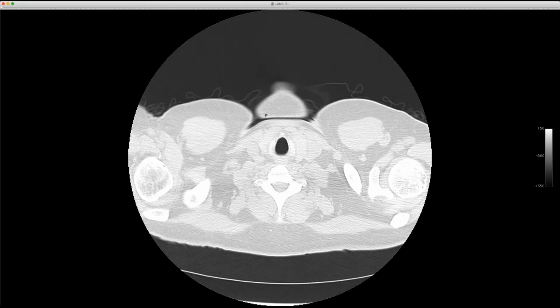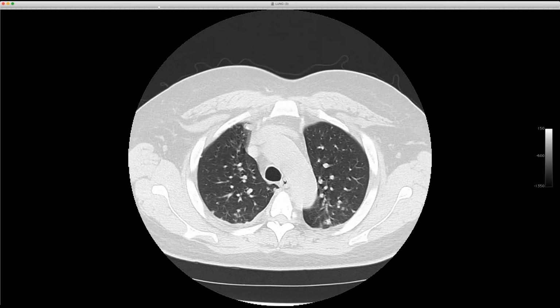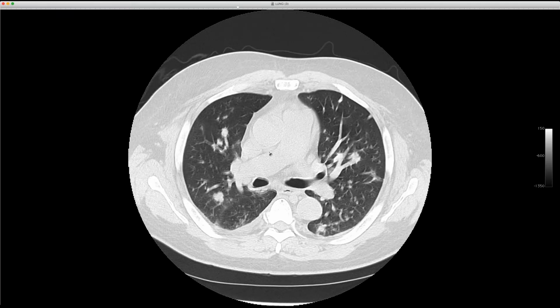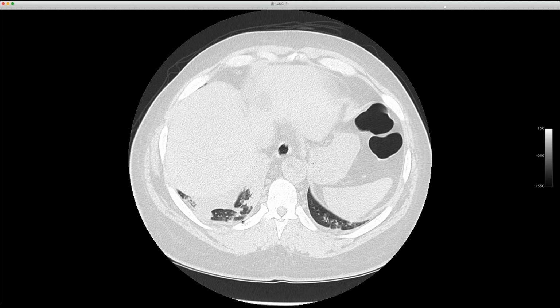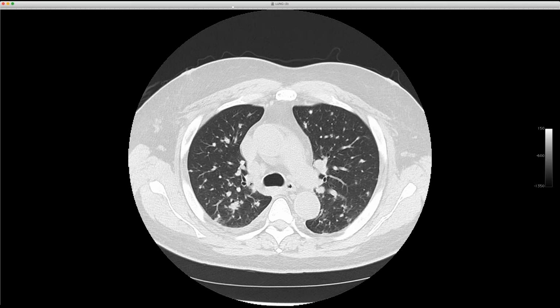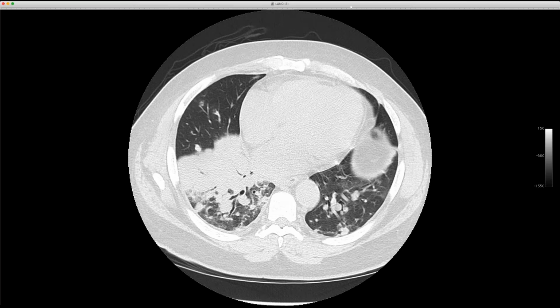So when I see large nodules that I can see on a radiograph, of course, I think about fungus. So this is his CT scan, and it was done about the same time as a two-view chest. And you can see there's all these nodules, small, large, and then he has this denser mass-like area of consolidation in the right lower lobe. Conspicuously, no pleural effusion, and really not much in the way of lymph node enlargement. So I do think about fungus when I see this, particularly this combination. And he ended up having blastomycosis, which I've shown you guys several cases of.